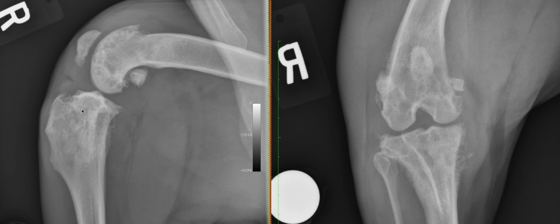And then the last feature of this case is also the presence of radiolucent lesions. So here in the subchondral area of the tibial plateau, you can see here also a bit of sharp edges of this subchondral lesion here. And we can also see some in the new bone itself, which appear a bit more lucent, and you see all this mottled appearance.